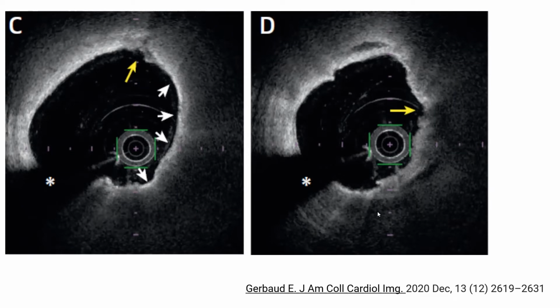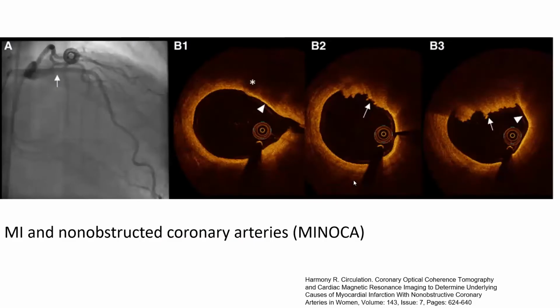This is another case of plaque rupture. Okay, again, fibrous intima, kind of thin, and there is interruption by a different looking substance that is darker. This is a thrombus formation. Okay, thrombus formation with cap rupture. Probably there is a lipid core here bulging along with the thrombus. Those are also more OCT images.